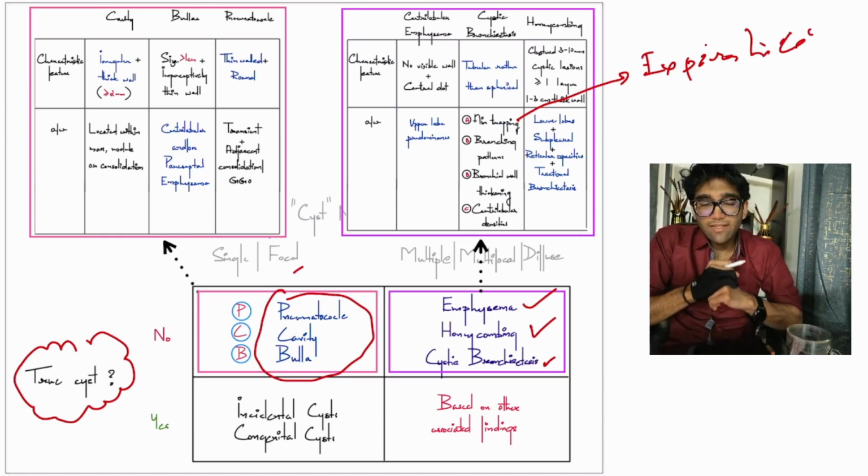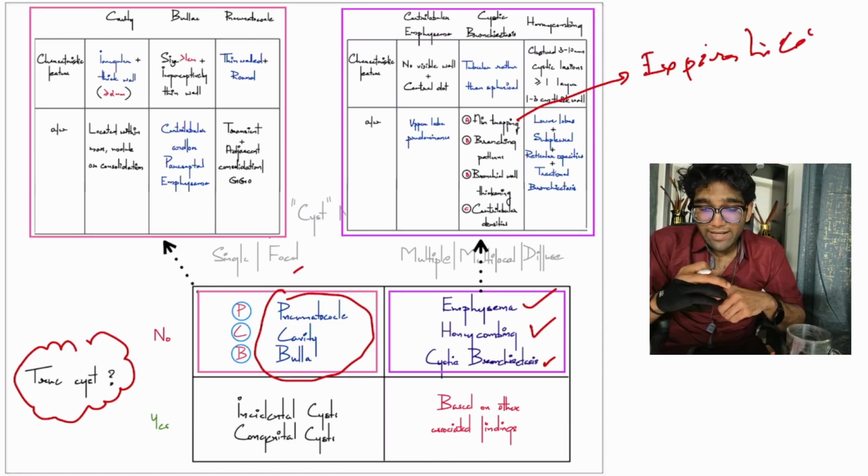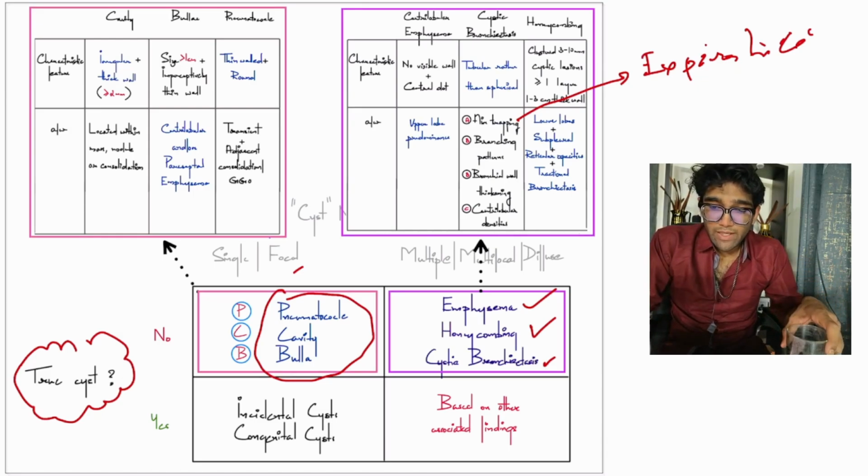The third is that there will be thickening, because, as we'll discuss when we discuss bronchiectasis, there is actually an inflammation and a structural change within the bronchial wall. So that results in a bronchial wall thickening. And finally, obviously it's an airway problem, so you may get a centrilobular opacity, okay, not an interstitial pattern. The others, the things we've already discussed.